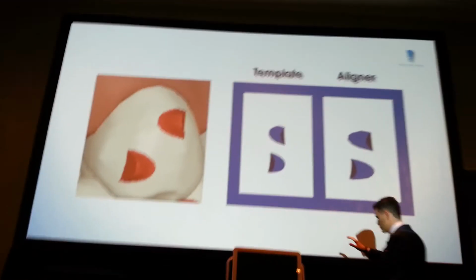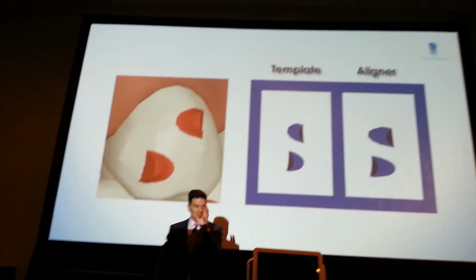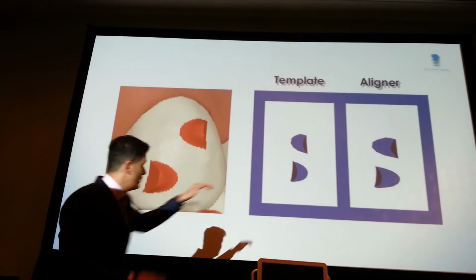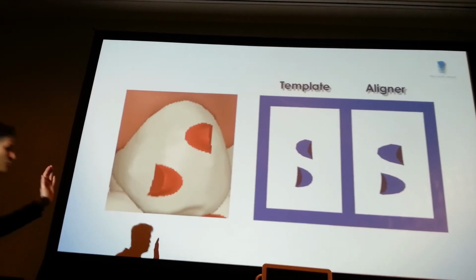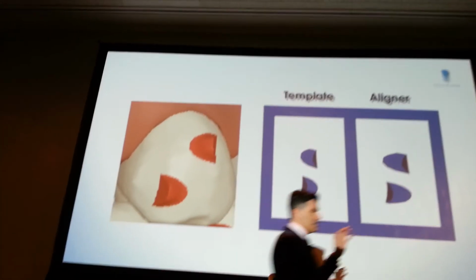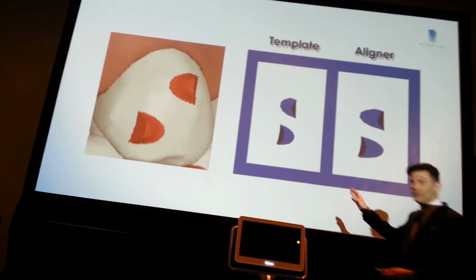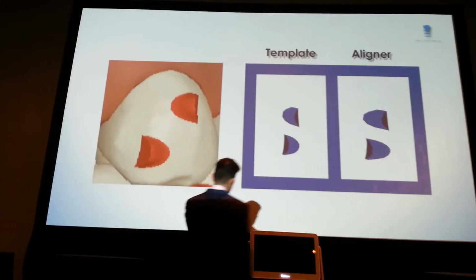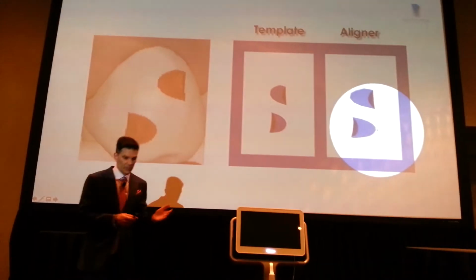When you have an optimized attachment, the force is applied on this surface, and in the aligners they make it bigger for the teeth to move. So if an optimized attachment fell out, either you keep the templates and redo it, or if you do it with your aligner, know that it's going to be too big, so remove a little part here just to make it smaller.